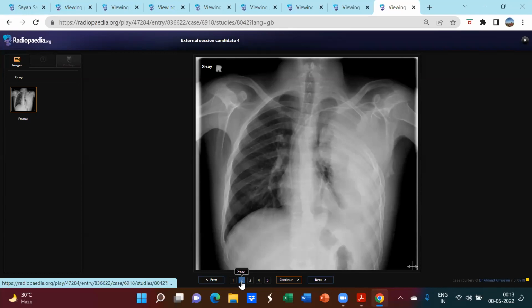In a young patient presenting with discomfort and with this large opacity in the left hemithorax, I would discuss the case with the clinician, whether the history is acute. What will you see from your end first?